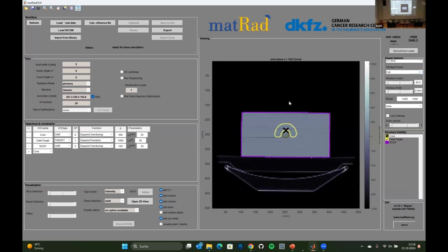I just changed my view a little bit to this again. Now, like I said, we are the engineer that got this system, a collimator and a photon beam to play with. So that's the first thing we will look at. We will create a simple photon beam.